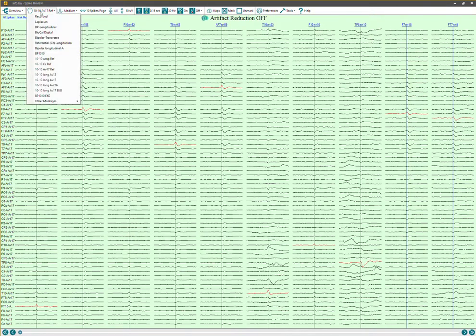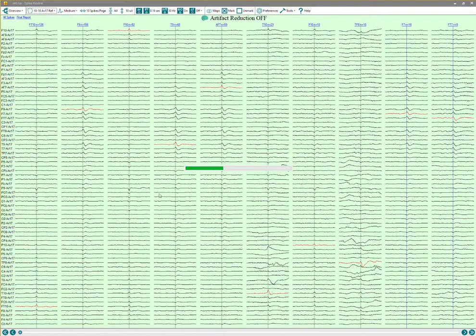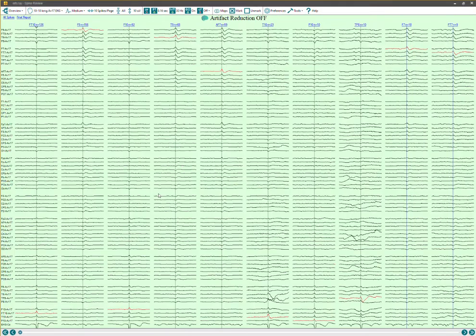So I'm going to select one that has the EKG channel already added, and again, in that previous screen we added the channel. You could save the montage and give it a different name and so forth. So now we can see that this average FT10, average of 126 detections, we see the EKG showing up in that as well.